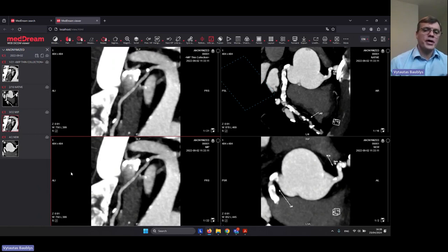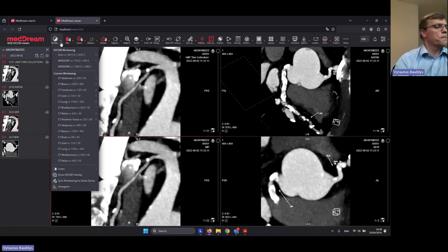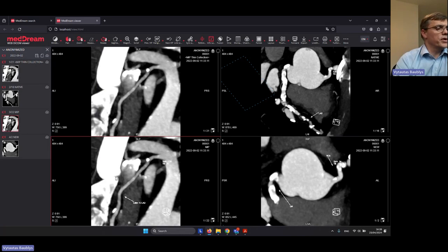At this stage, we created selectable overlays. In the future, definitely it will be possible to unselect all overlays or select all overlays. But at this point, just to deliver the function faster to clients, we created the possibility that you selectively control how the markers are shown.